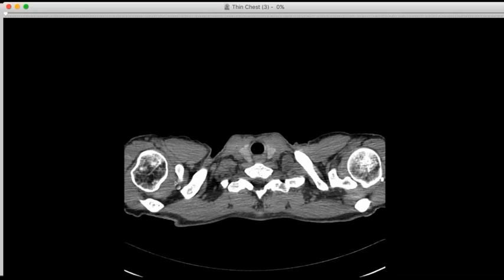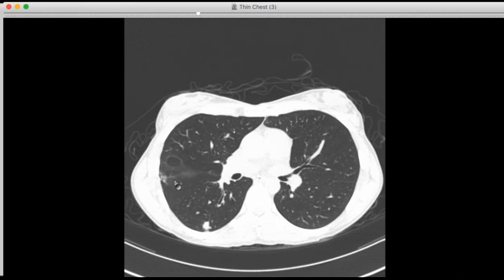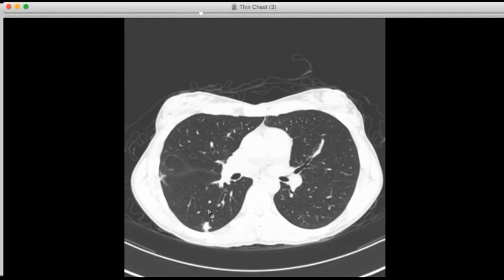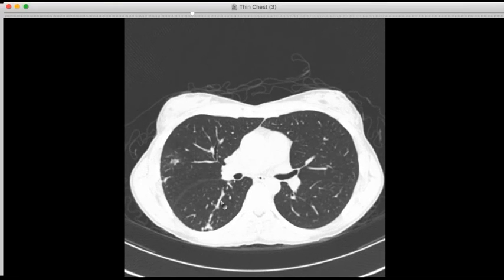So yes, and it's interesting because we end up following a lot of these nodules, at least until they get referred to us, but recognizing this pattern of this dominant nodule with all the little satellites, usually around the lymphatics. Like if you look at this vein here, for example, you can see it's kind of beaded, and those are little granulomas or granulomatous lesions, and kind of along the airways too. So it gets both venous and arterial. Pretty specific, and I'm sure David and Howard, you've seen this with cocci, can sometimes do this as well.